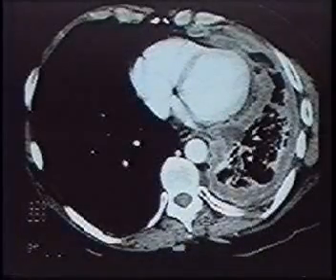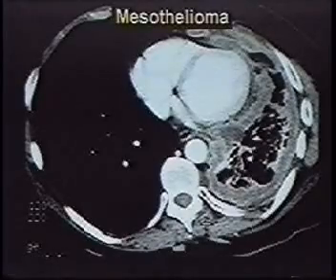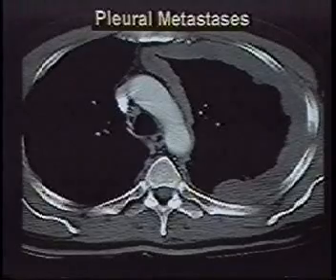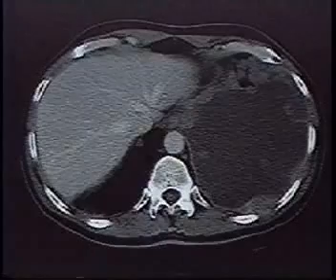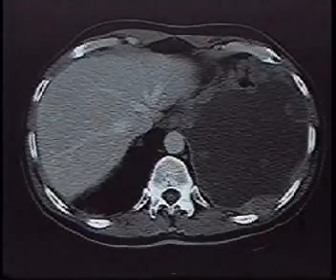Some examples of malignant pleural thickening. This is a patient with mesothelioma. Note the nodular, circumferential, and mediastinal pleural thickening. And this is a patient with pleural metastases, again showing nodular and circumferential pleural thickening. Another patient with multiple nodular pleural thickening and a large pleural effusion with parietal pleural thickening exceeding 1 centimeter.